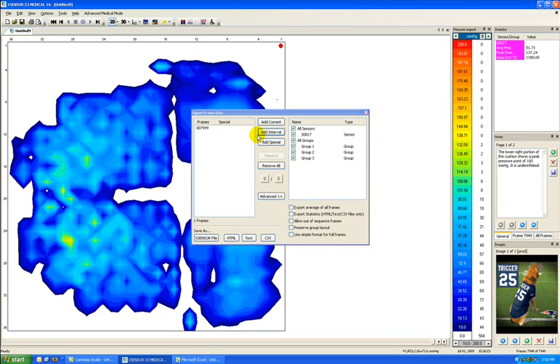We have a variety of different selection options here. We can add the current frame, add a specific interval, or add a special frame. The interval is probably the most important. So that's the one that would enable you to add a specific set of frames or all the frames at once. So if I were to select between 1 and 1000, I would have all those frames added into my document. So you can see the counter begin to accumulate, and I have all of the frames available for my export.